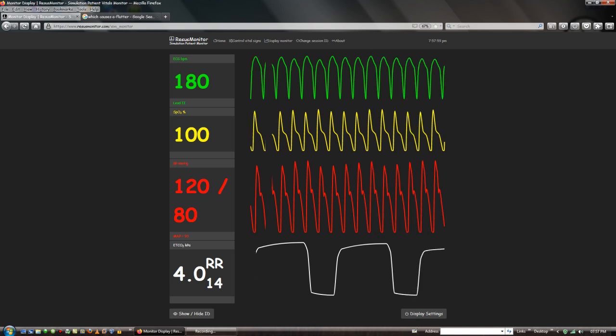The heart needs to pump as fast as it can, and the heart's internal components, like the atria, quiver a lot faster. This EKG rhythm should be defibrillated, or cardioverted if available, but in most cases it is not.